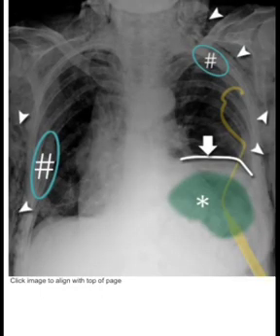Surgical emphysema, erect chest X-ray, left chest drain, orange, raised left hemidiaphragm, stomach or bowel bubble, that is asterisk, multiple irregular areas of low density within the chest wall soft tissue, multiple rib fractures. Clinical information: road traffic crash, chest pain, shortness of breath, and marked clinical surgical emphysema. Diagnosis is multiple rib fractures complicated by left hemidiaphragm injury, left pneumothorax, and widespread surgical emphysema.